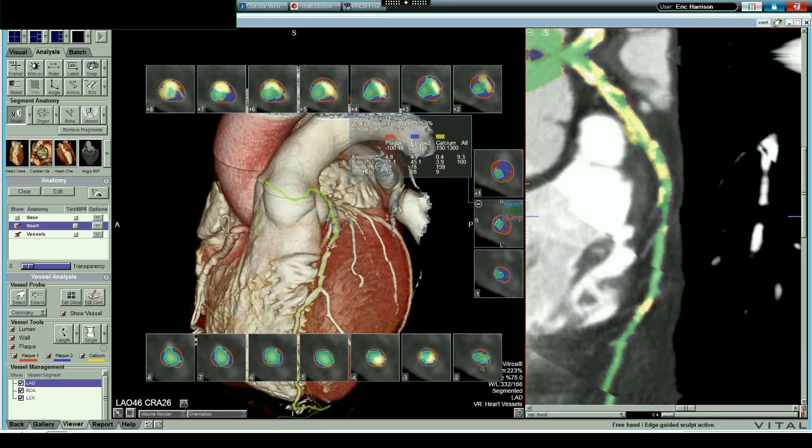And then the measurement of the amount of necrotic core, which is designated color-coded red, is the highest number we've had of a necrotic core in a significant plaque. And so this is 51.1% necrotic core. And so there's very little blue. There's a lot of red.